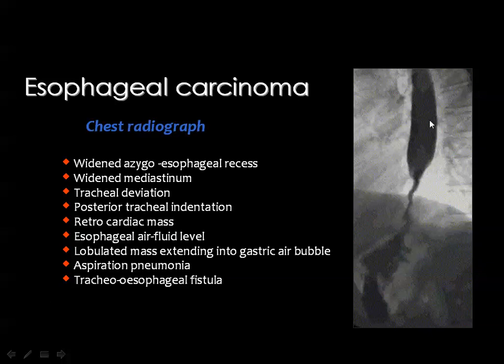But if you look carefully, you can see that the esophagus proximal to the stricture is not markedly dilated, it is moderately dilated. And then you should have an endoscopy to exclude the possibility of carcinoma, which may sometimes be misdiagnosed as achalasia from radiography, but the clue is the degree of dilatation of the esophagus proximal to the stricture, which is usually mild in cases of carcinoma.